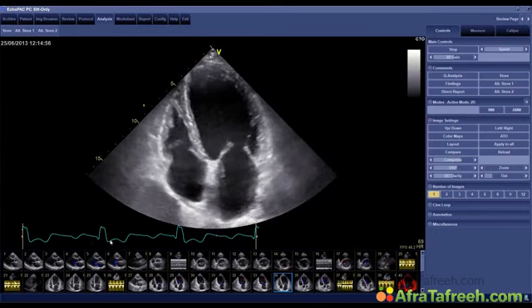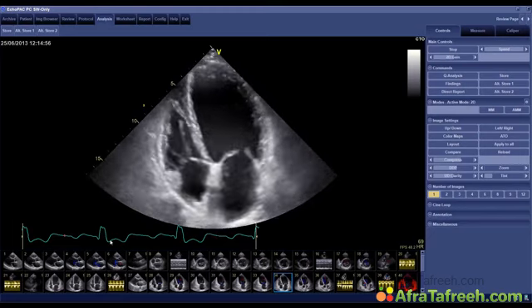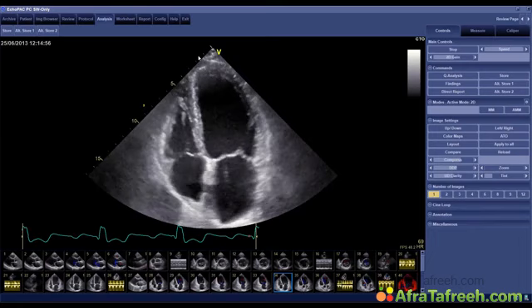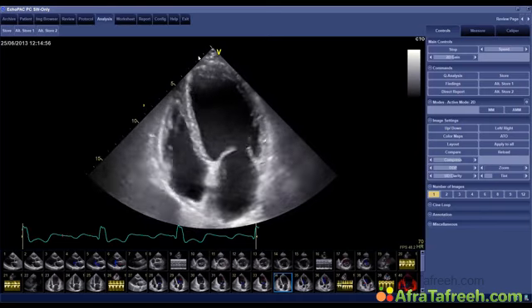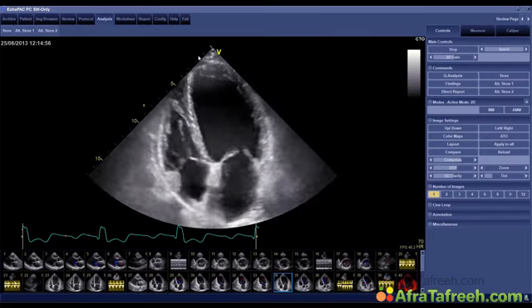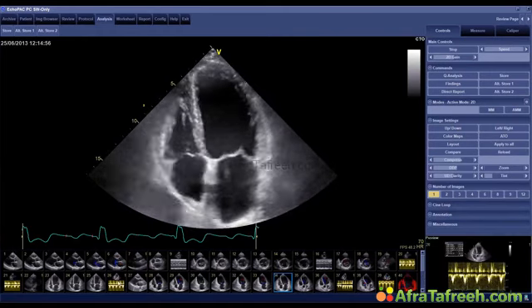But do you think that it is a classic left bundle branch block or not? Well, I don't think so, because if the patient has such a wide QRS complex and it's a left bundle branch block, you probably see more dysynchrony. In reality, the patient did have a right bundle branch block and not a left bundle branch block, which rarely leads to significant dysynchrony. This is a very important factor in this patient, because CRT therapy is probably not something he would really benefit from. If you look at the motion of the wall, lateral and septal, there is not much dysynchrony here.